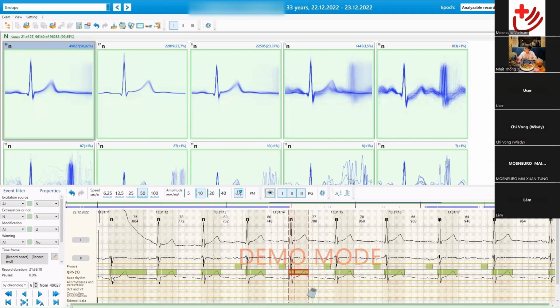It can take a long time. And sometimes here I see the error. Yeah, this complex is marked wrong, so I could, like, no, but it's difficult. It can take a long time. So I have a tool to perform this automatically, some correction automatically.